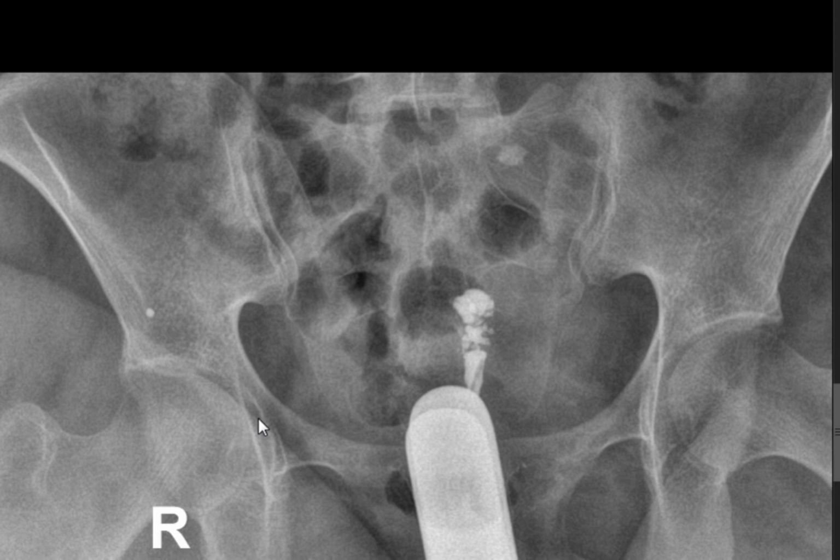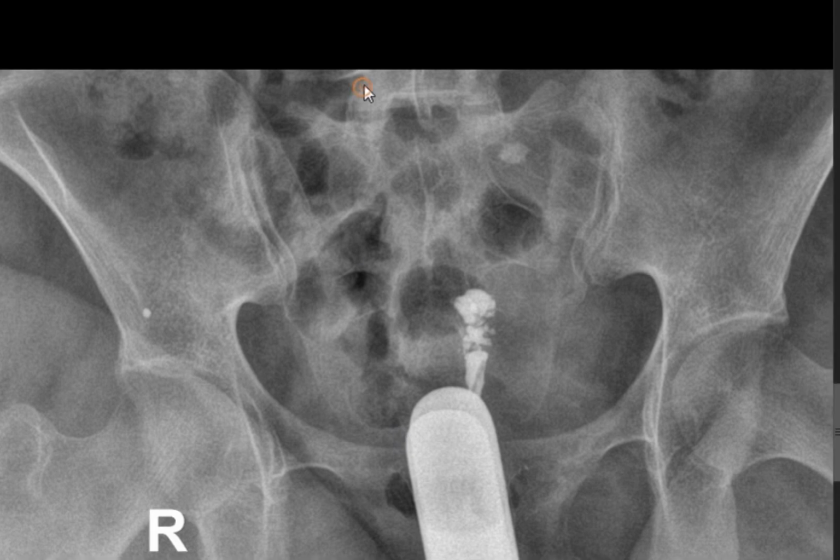What do you mean, not filled regularly? Like adhesions, like adenomyosis, I mean. First, adenomyosis, you don't see it by hysterogram. I don't see it, but there will be abnormal filling also. You don't see it?